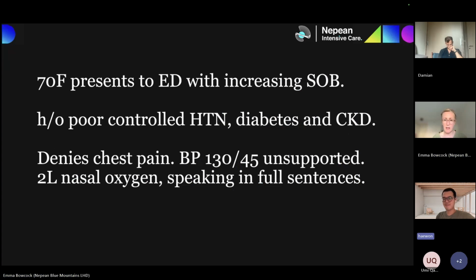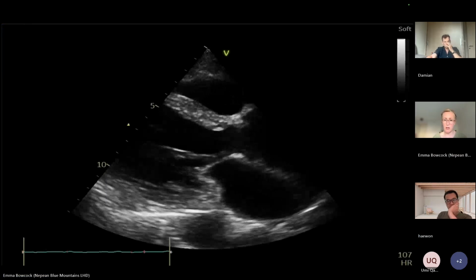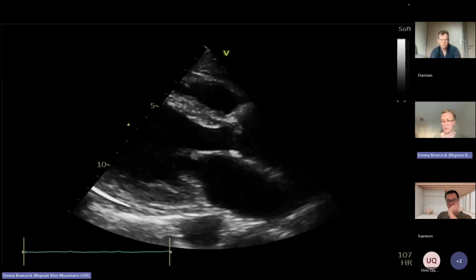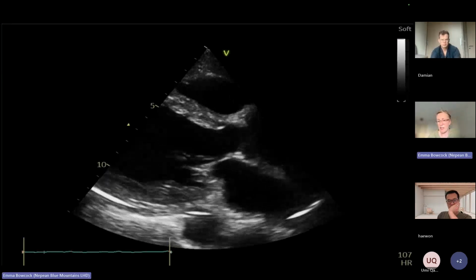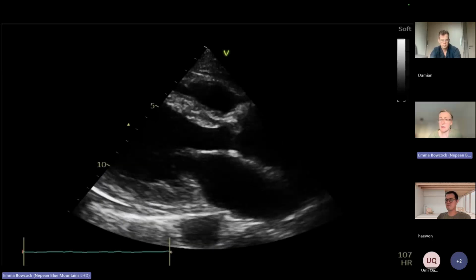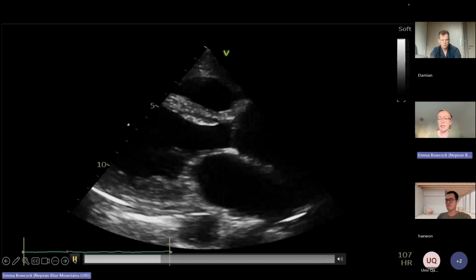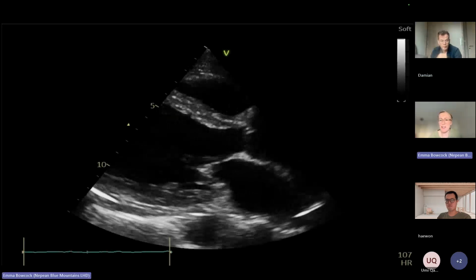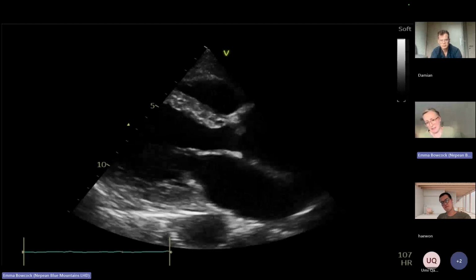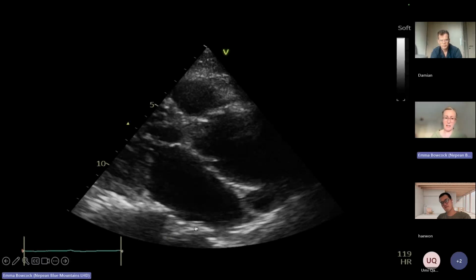But thanks, Emma. All right, there's another one that we could quickly go through. I've shown this one before, but if anyone wants to just take this one and comment on it, you can, or I can go through it. It's up to you. But it is quite a good one for those of you that haven't seen it before. I think I need to put some new cases in. Come on to the next one.